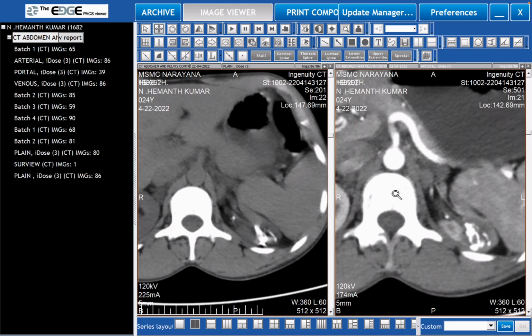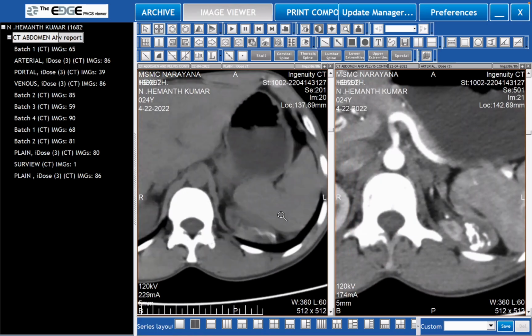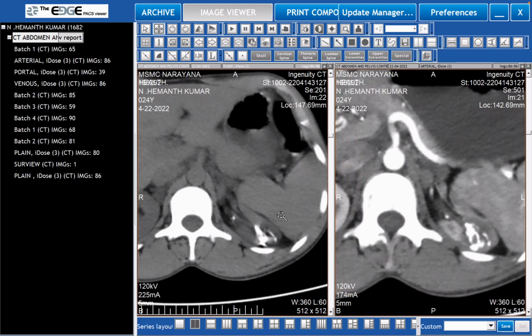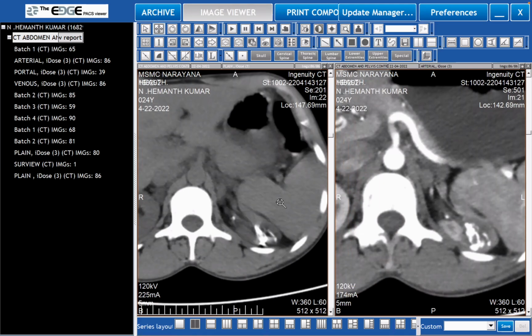Shubham, we discussed this. Answer that question. So it's mostly calcification, sir. Since it's a corticomedullary phase, we cannot comment on the reason of contrast.